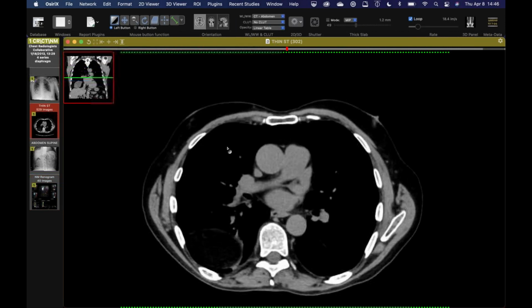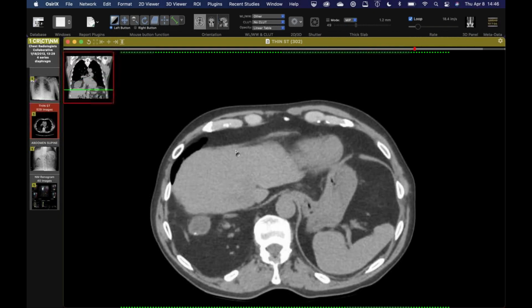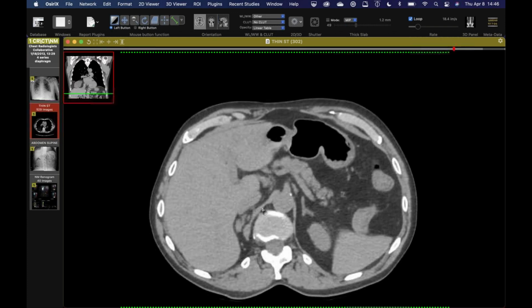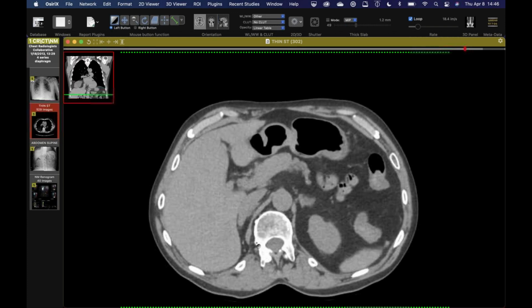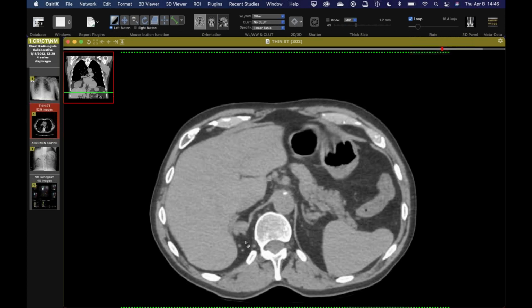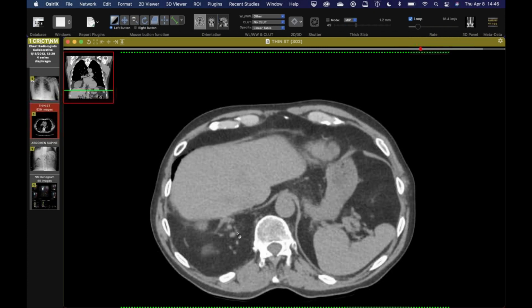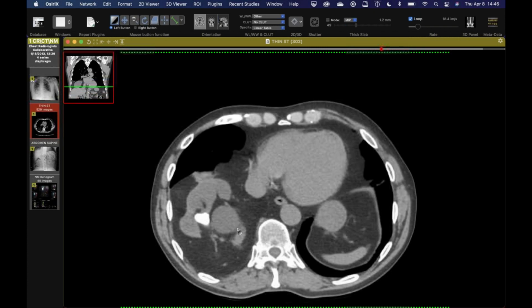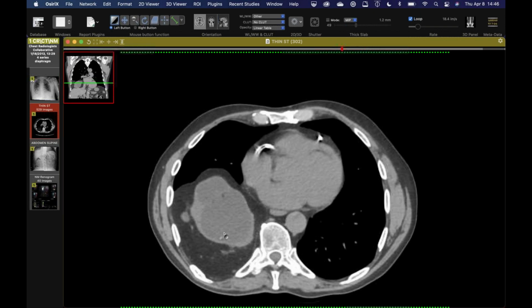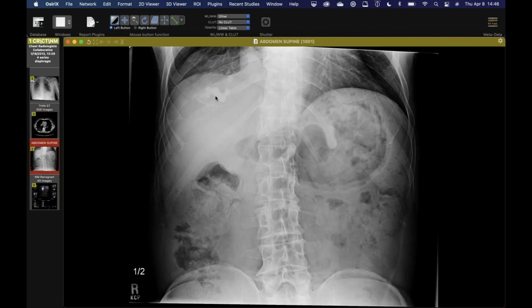So an intrathoracic kidney, and going back to the CT again, usually they enter through a Bochdalek hernia in the absence of a traumatic diaphragmatic defect. And you can see if we come down to the diaphragm, there's the crus. So it's a healthy looking crus, but there's a sizable defect back here, because if you compare to the other side, we can follow the diaphragm around. There's just a huge defect in this general vicinity, and so the kidney has somehow managed to work its way up in here, taken all the perinephric fat and vessels, and it's been there for a long time, but we see it going back years. It's been kind of chronically obstructed because of this. The left kidney is in its normal location.